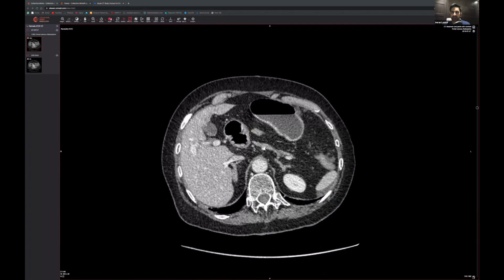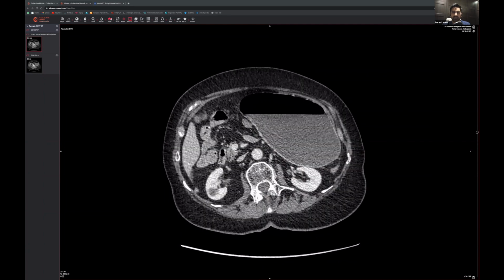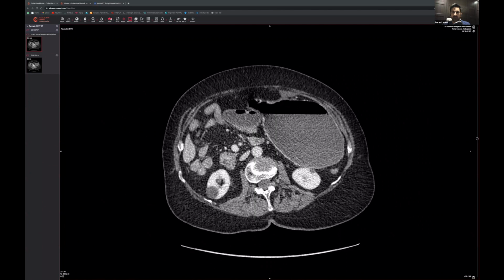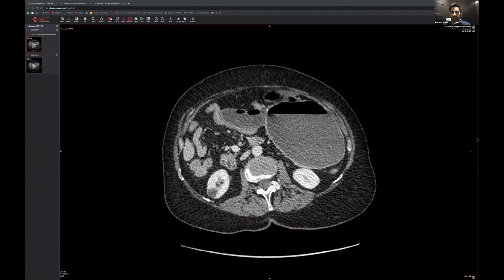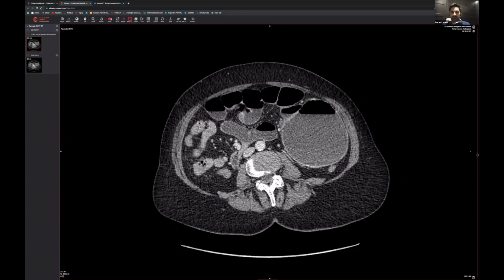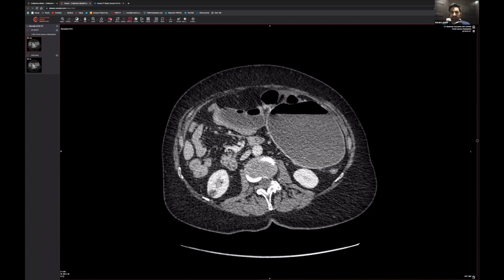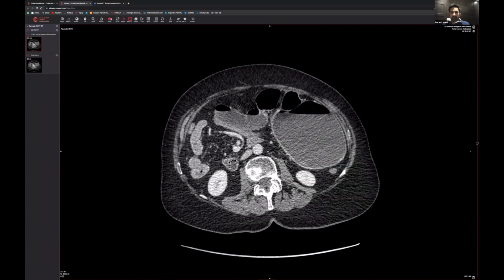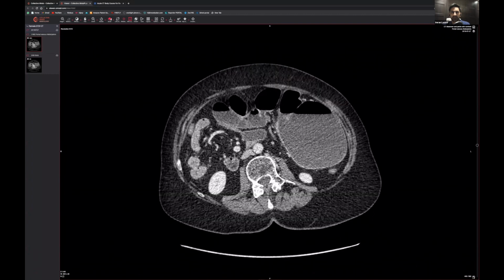We're following along this way, and that transverse colon does look a little bit collapsed, but we're following along, follow my mouse, going this way. We're coming up to, well, it should really be the ascending colon, but we're quite mid-abdomen now, aren't we? Should really be over there. We come up to this point, it looks like it's slightly dilated and a bit difficult to follow, isn't it? It just seems to sort of become what? Small bowel located within the area. So let's come back up. We'll come this way. I reckon we're going that way. Maybe that way, is it? Coming up that way. Very odd looking bowel, isn't it?